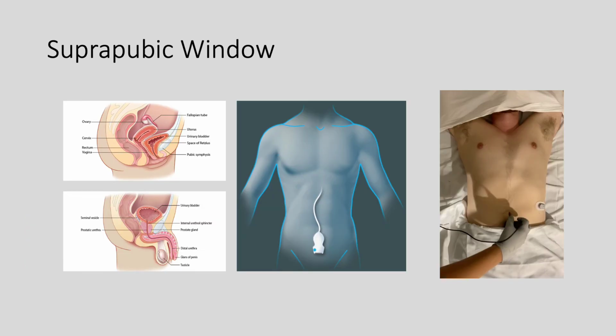When looking for free fluid in the pelvis, it's important to consider your patient's gender, as free fluid has a tendency to accumulate in different locations. Additionally, females may have a scant amount of normal physiologic fluid accumulation in the pelvis and the pouch of Douglas. The rectovesical pouch is where free fluid will accumulate in the male pelvis, and in females, the pouch of Douglas is where fluid will accumulate.